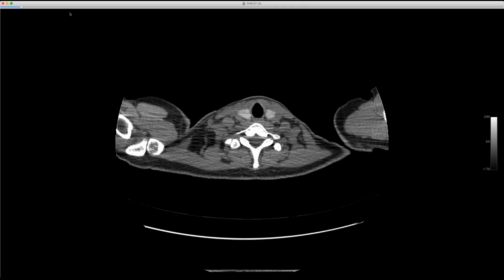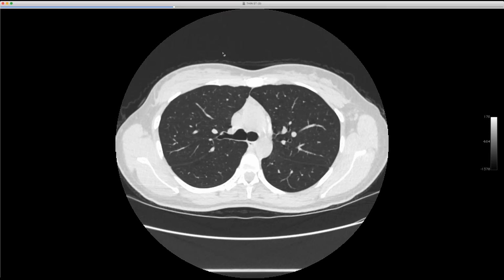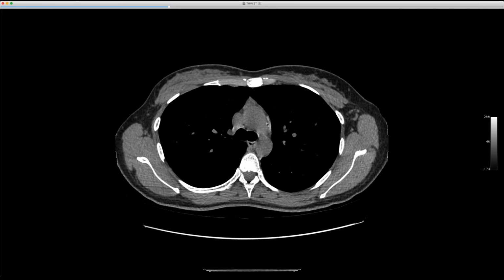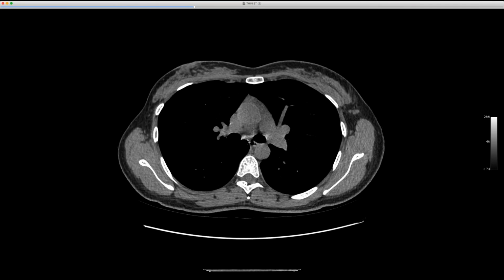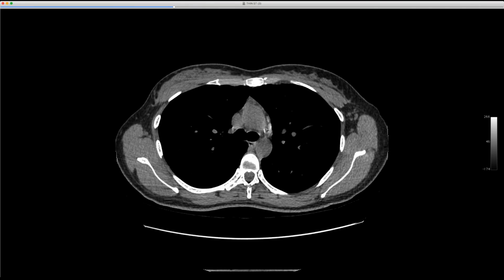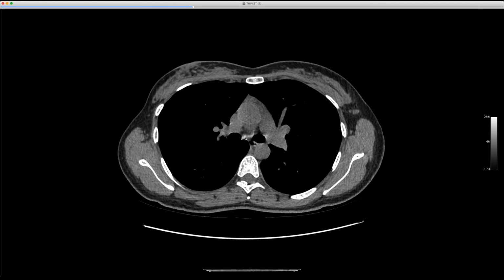This is an engineer who works locally and who's been exposed to a lot of beryllium. And there was nothing in the lungs, but Chris made a great observation that you can see the lymph nodes in the mediastinum are actually pretty dense, and it's not artifact, and it's all of them. It's pretty consistent. They're not enlarged at all. So probably, we can see that with early sarcoid, but I suspect there is beryllium granulomatous inflammation related to beryllium in the mediastinum.